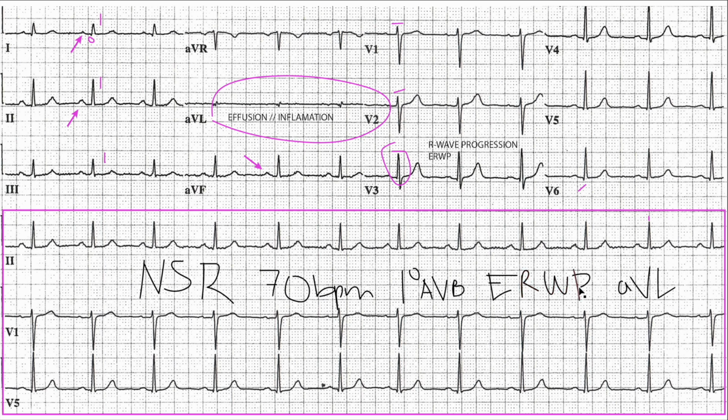Also, ERWP, or early R-wave progression, in combination with this and that borderline first degree AV block, you could have something here. What exactly? Well, that's for the physician to diagnose. But as far as the rhythm and rate, normal sinus, 70 beats per minute, this is a red flag. Get this to the physician's attention as soon as you can.